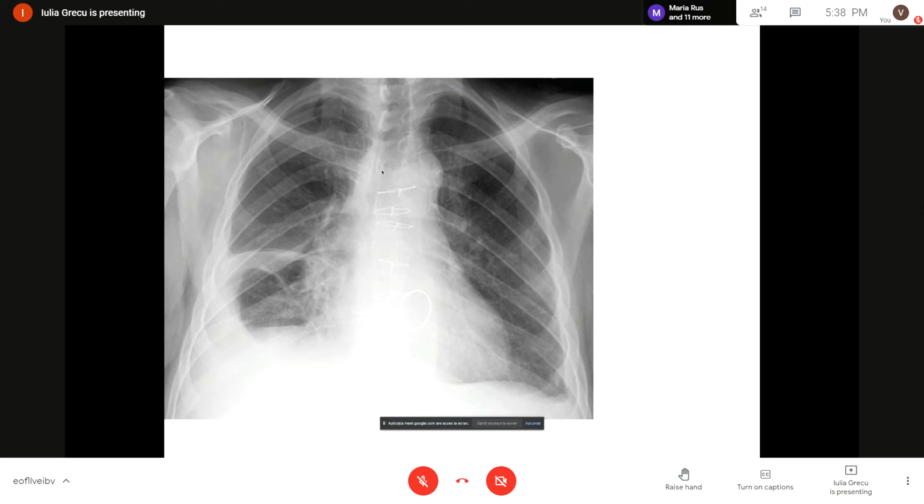Another thing. I think posterior anterior or the other way around. Okay, how do you think this was done? I remember with the scapula, if we see it, then I think it's posterior anterior. The scapula is quite out of the picture. Only here we can see a bit of the medial part of the scapula.